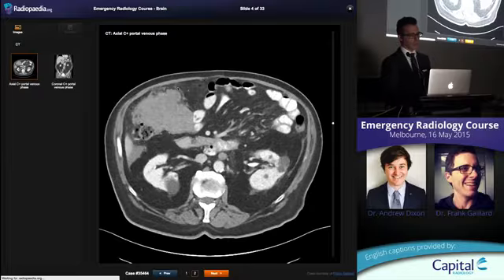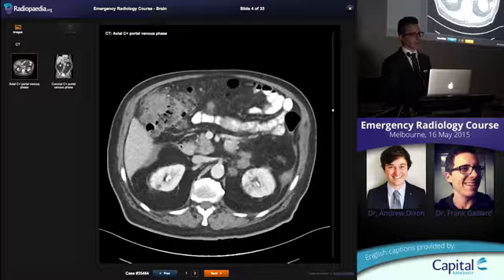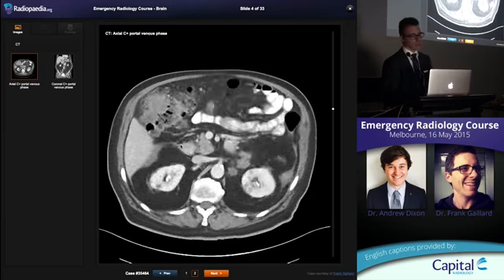But you sometimes do want to go fossicking, and knowing which lesions you're looking for, you can start having a look. This patient had an enormous lump, which was incorrectly called a colorectal carcinoma. Colorectal didn't appear on that list I showed you. It's not a common cause of cerebral metastases, and when it does, it's not hemorrhagic.